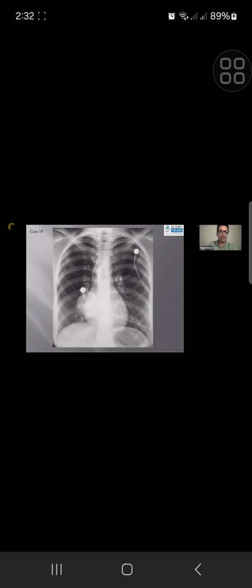You did say that you did bring in mediastinum in here. Yeah. But it's not mediastinum, is it? It's outlined by air almost through and through, isn't it? It is projected over the mediastinum, that's correct. But it's outlined by air, isn't it? Mediastinum is the space in between the two lungs.